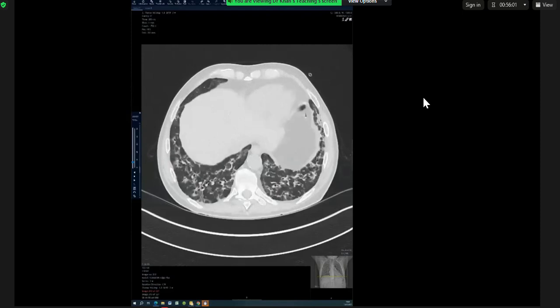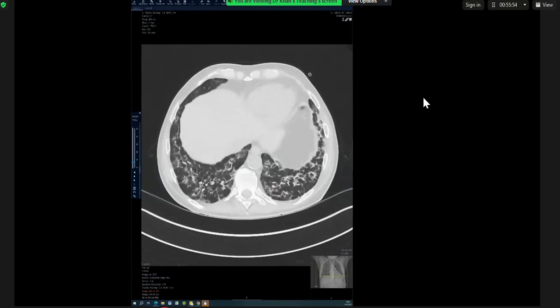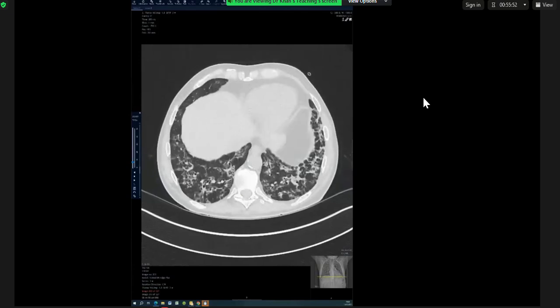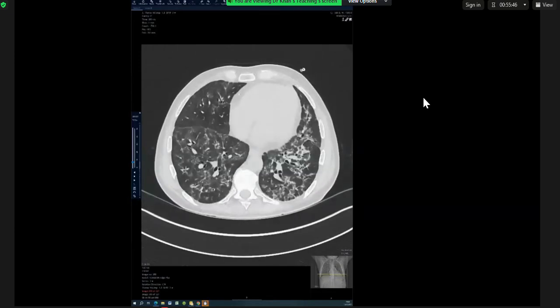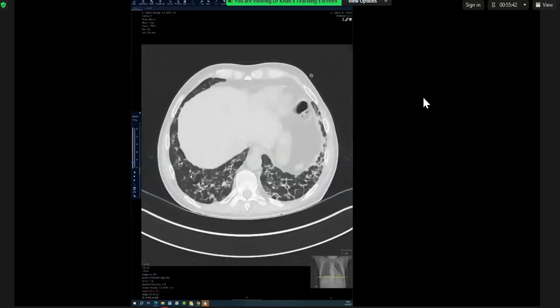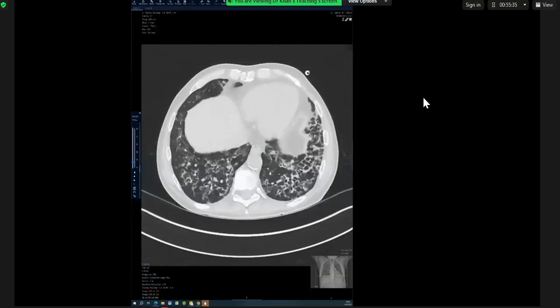All the bronchi are getting dilated. Yes, so all the bronchi are surrounded by linear-looking consolidation. And that's called architectural distortion, and it's called traction bronchial dilatation. So that process is actually starting to scar, and it's starting to pull the lung around it. Infection doesn't do that. Yeah, it can do that, but it's not that symmetrical and bilateral. Organizing pneumonia is a good thought. You're thinking down the right line, but the pattern doesn't fit organizing pneumonia.